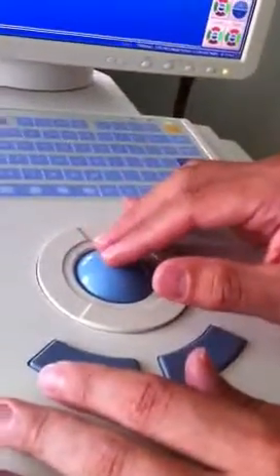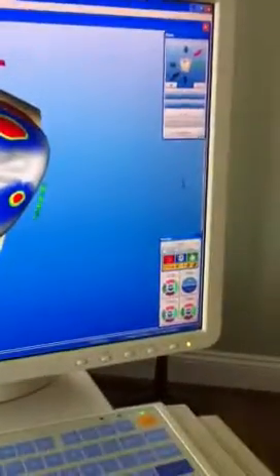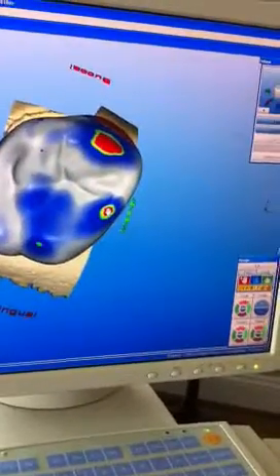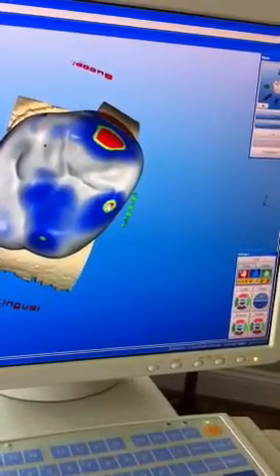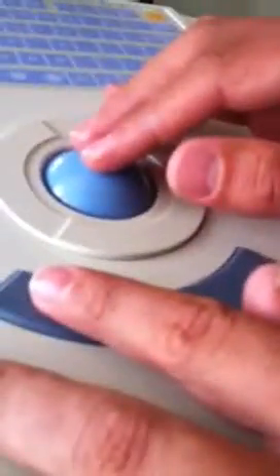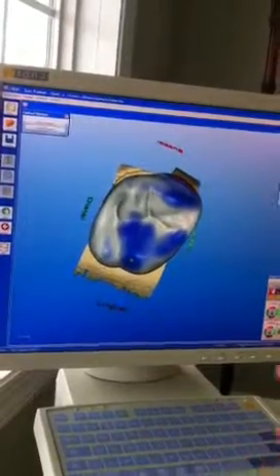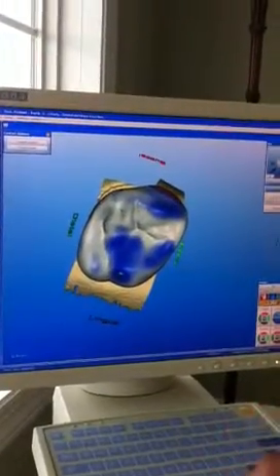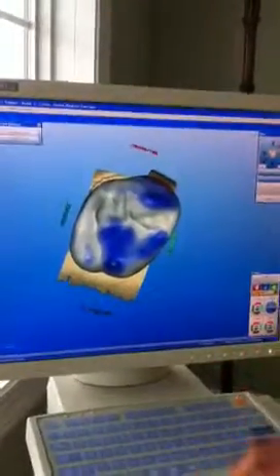And you can do this in two ways. If you want to just take a little bit at a time, put your hand over the area that you want to subtract. Well, actually, I think I have add, so let's say I'm going to subtract this area. Just click once, so you can see, or you can actually maneuver the hand around and hold down the left button, and it takes a lot more material away at one time. You see how I did that? So I've got the hand over, I'm holding down the left button, and I'm moving, and it's actually taking away a lot more tooth structure. I got it. That's just a speedier way of doing that. You may feel more comfortable with just clicking one at a time, but you'll eventually start polishing the whole area, taking more material away quicker.